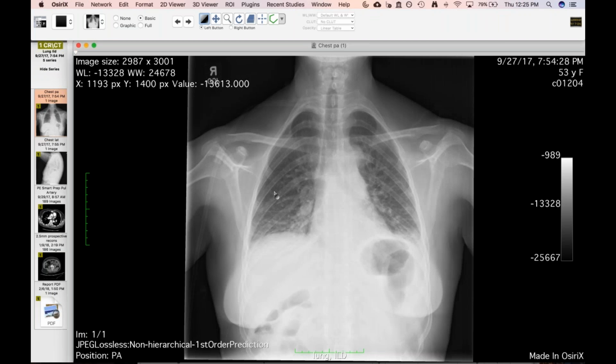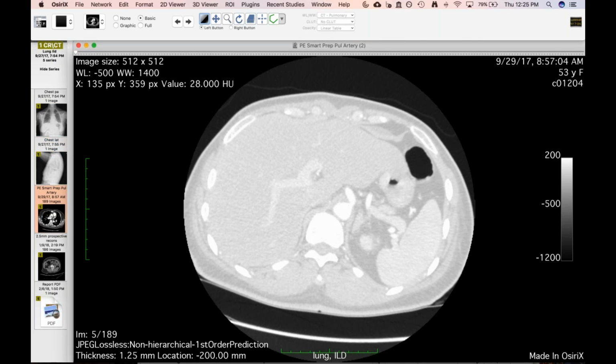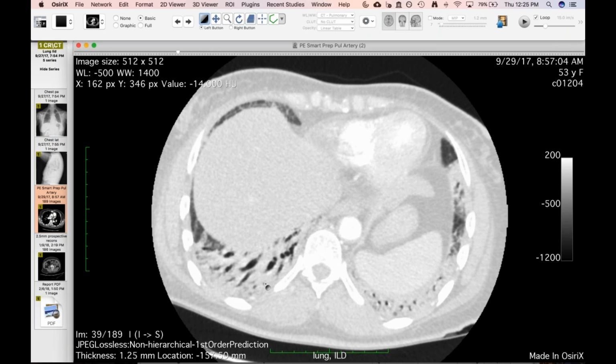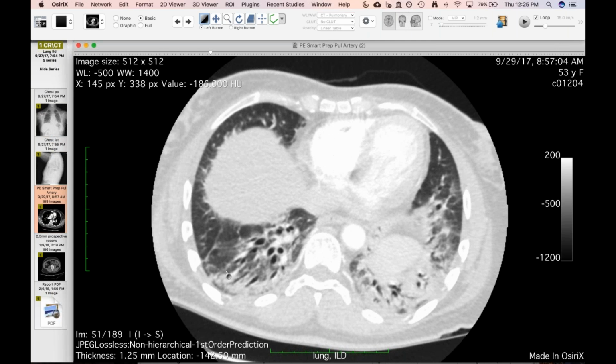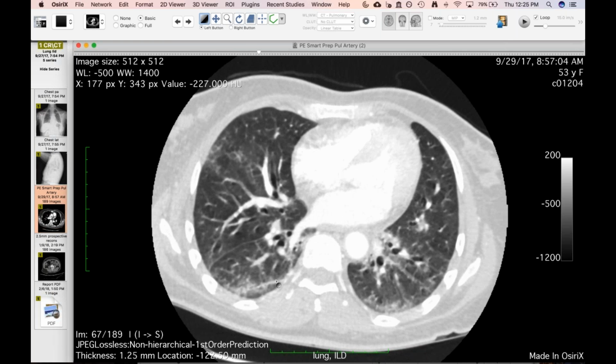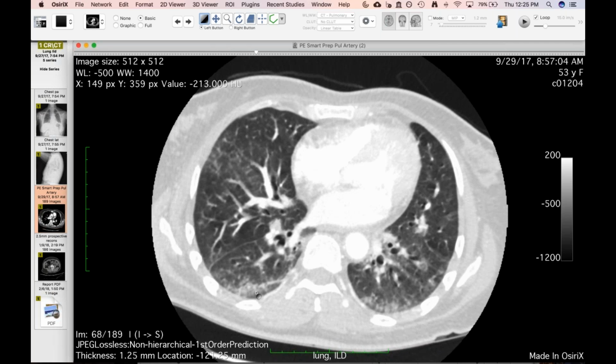Yeah. So this case came in around the same time too. This was a couple weeks before that, and this lady had a little bit of a different presentation. She's a little bit older, but again, on the radiograph, you can see fairly symmetric opacities in the lower lung zones. A little bit of blunting, maybe small effusions, maybe just consolidation. Of course, she undergoes the requisite PE study. And you can see at this point, she already has a little bit of dilation of her airways and presumably some traction bronchiectasis, that some of this is irreversible. But it's a very similar appearance to the second CT on the other lady, with lower lobe predominant consolidation. It's a very striking lower lobe distribution.